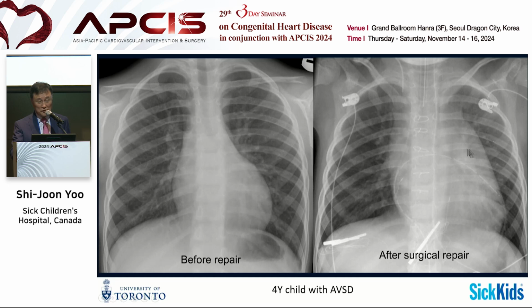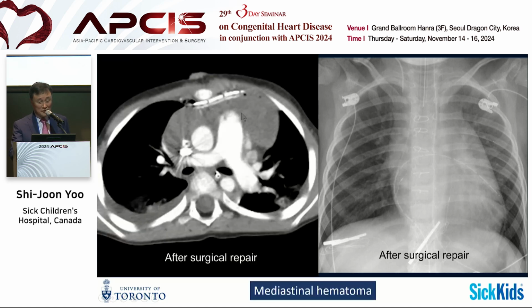Okay. So post-surgically, you have a wide superior mediastinum. Don't be shy in describing there is some collection. Okay. In the CT, you can see a large amount of mediastinal collection.